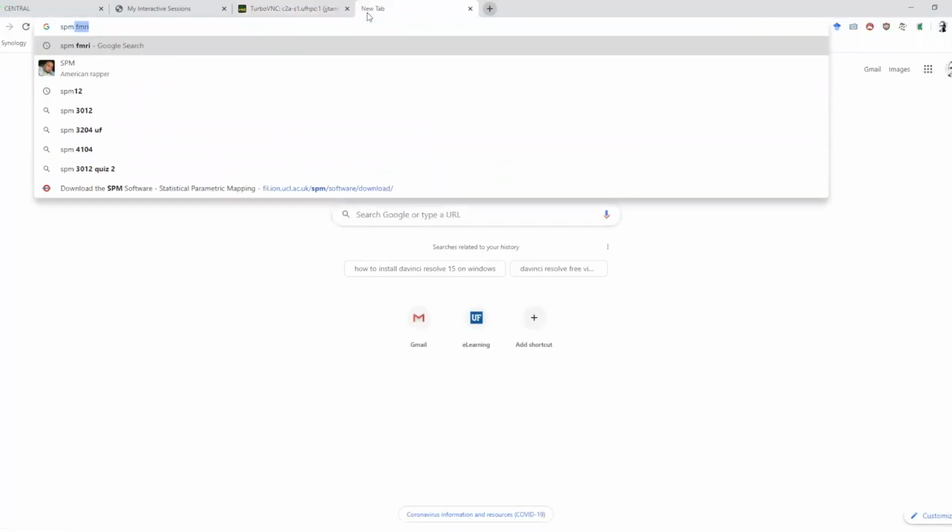But if you happen to have MATLAB already running, or you have MATLAB on your personal computer and you've downloaded CONN and SPM, this is how you would launch it. You would open MATLAB, and this is going to take a little bit of time to load over here on Hypergator. So what I'm going to do is open a new window and show you SPM.